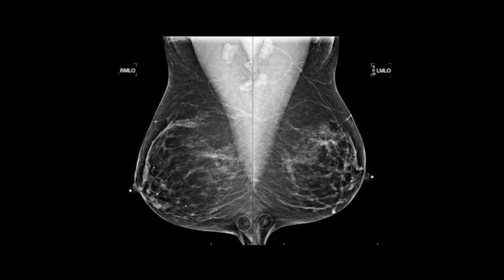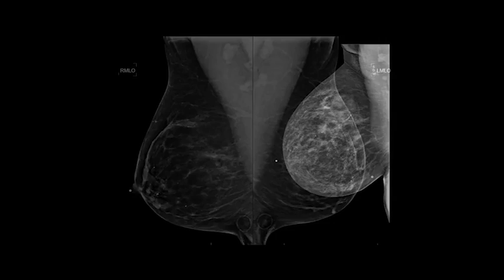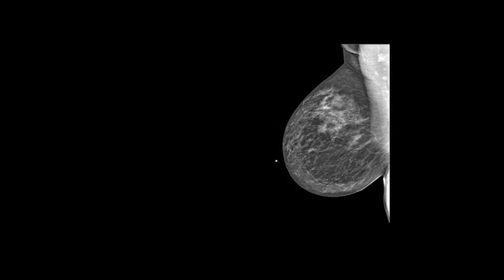Just one or two little tiny things like these tiny skin folds up here or a little fold down here, but they aren't going to give you a deficiency for it. They'll just mark it off. Remember, a deficiency is where you truly don't pass the first time. It's not a failure yet. It's called the first deficiency. So these images are absolutely beautiful to turn in for accreditation body.